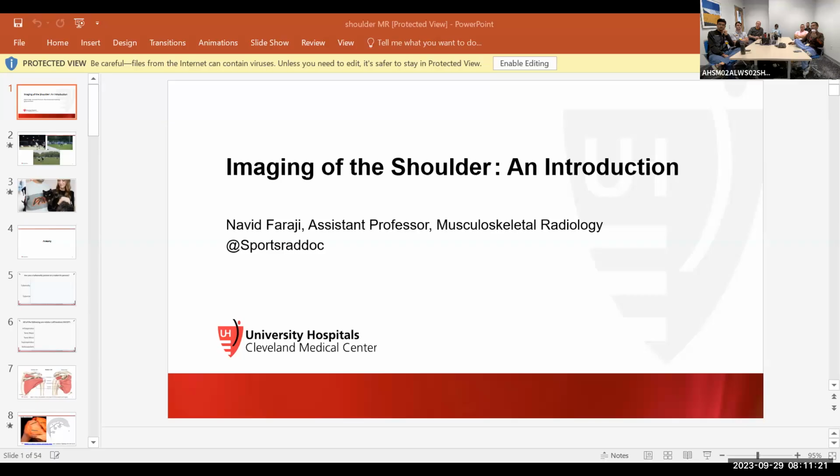And you can see the subscap has this multi-pennate tendon architecture and the coracoid process. When we're looking at MRs, it's really important to look at the bony structures to orient yourself if you don't have multi-planar imaging or in the moment. So coracoid process, if I'm seeing that, I'm seeing a tendon beneath it, it's the subscap. And then the supra is the most anterior of the greater tuberosity insertions, and then infra and then teres.